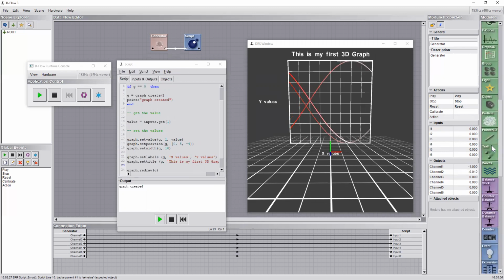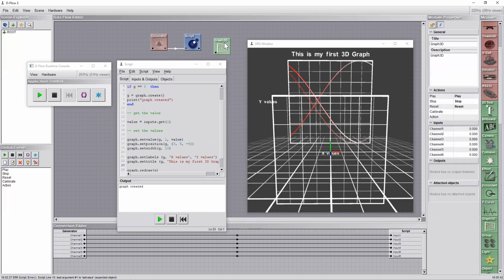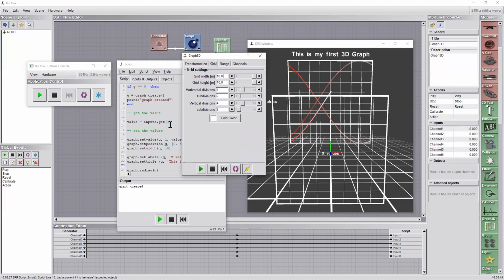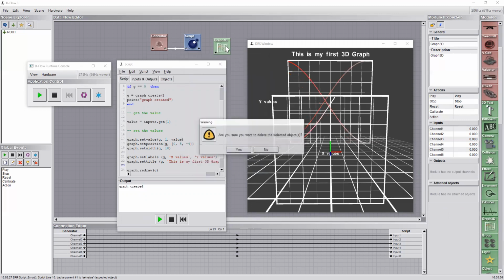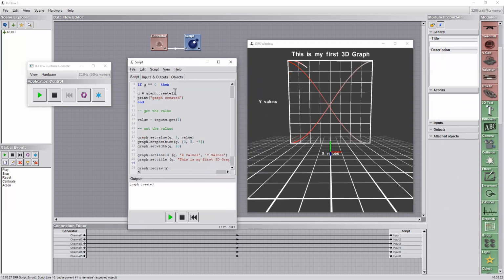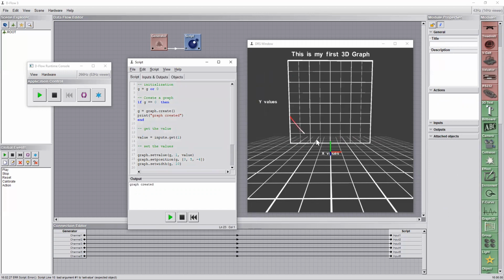You could have had a 3D graph like the one that we have here. If I can find it here, right? But that is not having all these details that I showed you here, right? You cannot have all this. You have some details, but you manually need to do that, right? So here you have access to nicely all these little things, and you created everything. And every time that you need something else, you can just bring this code. And that's it. That is part of your application that you wanna create.